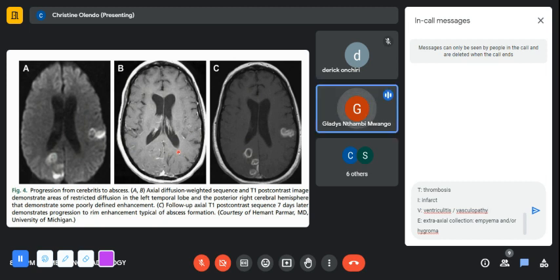Unless you start saying maybe in that right occipital lobe, you don't see the sulci very well. They're a bit hazy, so there's some edema there. And maybe some increased vascularity, but it can be a bit dicey to call it. But if you look at the DWI, you can be much more confident.